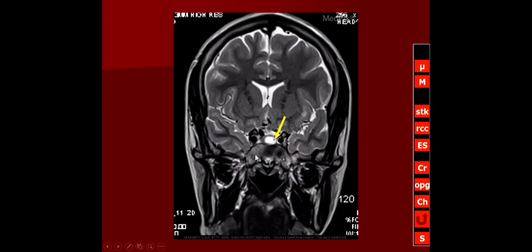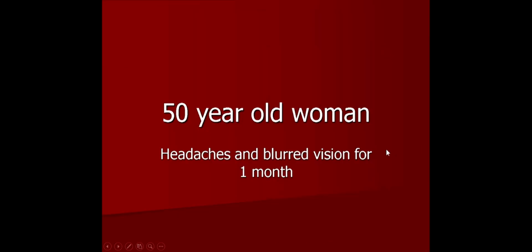Amit, do you use that nodule sign to diagnose Rathke's cleft cyst, where there's a little hypointense dot there? The literature talks about this. Do you guys read the literature and then realize that it has no applicability to the real world? Does that ever happen to you? Because this is one of those things where your differential is craniopharyngioma versus Rathke's cleft cyst. If the patient is symptomatic, they're going to take it out. If it's really small and completely intrasellar, they're not going to take it out if the patient's asymptomatic. So that's just something to keep in mind.